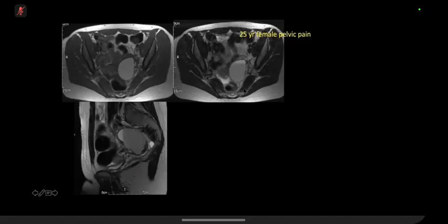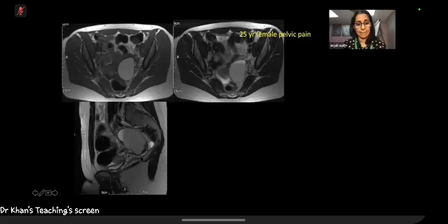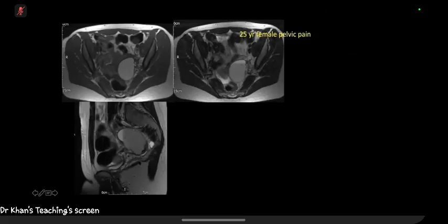This will be a T2 with a fluid level, with the highest signal being in the upper part of the fluid. And the last image, I think this is a T2 sagittal, which shows some low signal intensity in the inferior aspect of this lesion. So this is a cystic lesion with three different signal intensities.